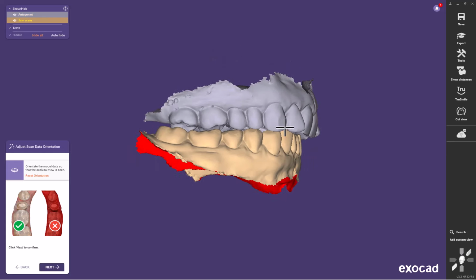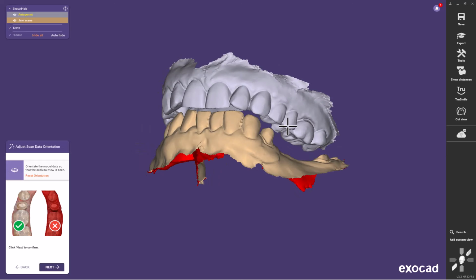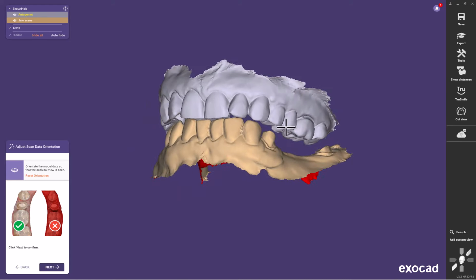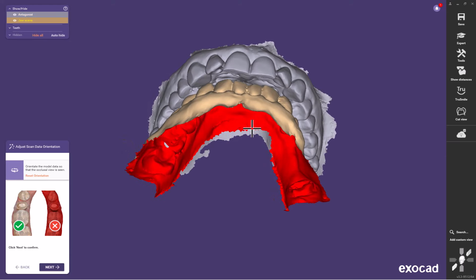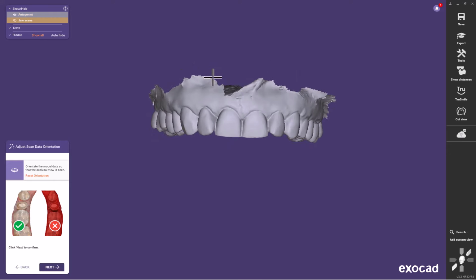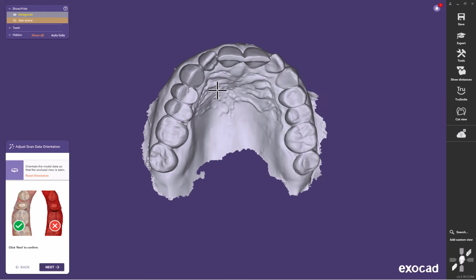So you can see that things are not ideal. Her maxillary incisors are reclined lingually, and so obviously it's not going to be a perfectly ideal occlusion, but we see what we can do. Now, I've already done this equilibration, and in the process I determined that if you notice these cuspids here, these are crowns. Those are not natural contours. Those are crown teeth, and they've been restored with no cingulum. They have absolutely no cingulum whatsoever. Very common.